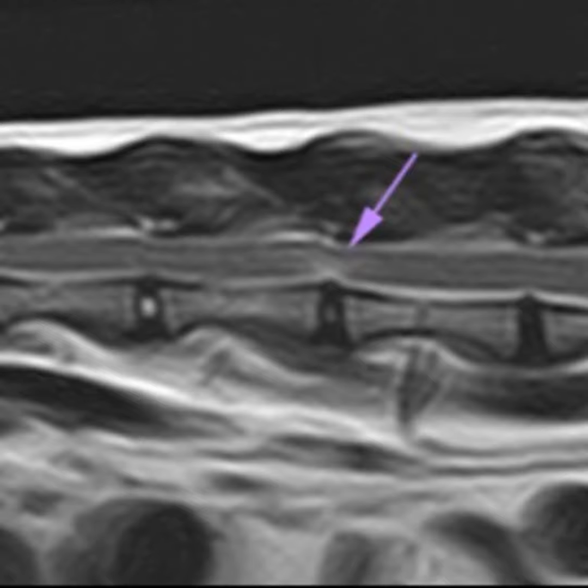For the mean age, the mean age of our cats was 8.7 years, which is in agreement with the mean age of all the published feline cases to date, which was 8.3 years. And as previously reported in these two studies, it highlights the occurrence of this condition in mature cats. But when considering each type of intervertebral disc herniation separately, the mean age of cats for intervertebral disc protrusion was 10.1 years, for disc extrusion 7.8 years, and for the acute non-compressive nucleus pulposus extrusion 8.4 years.